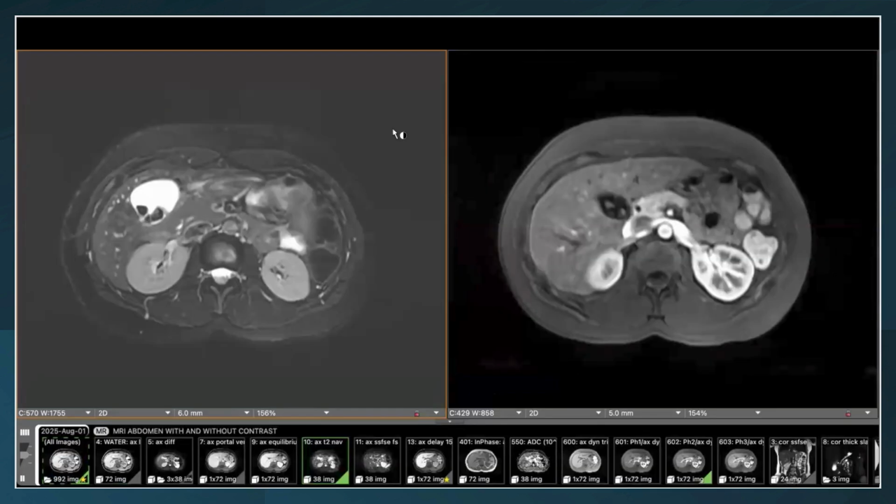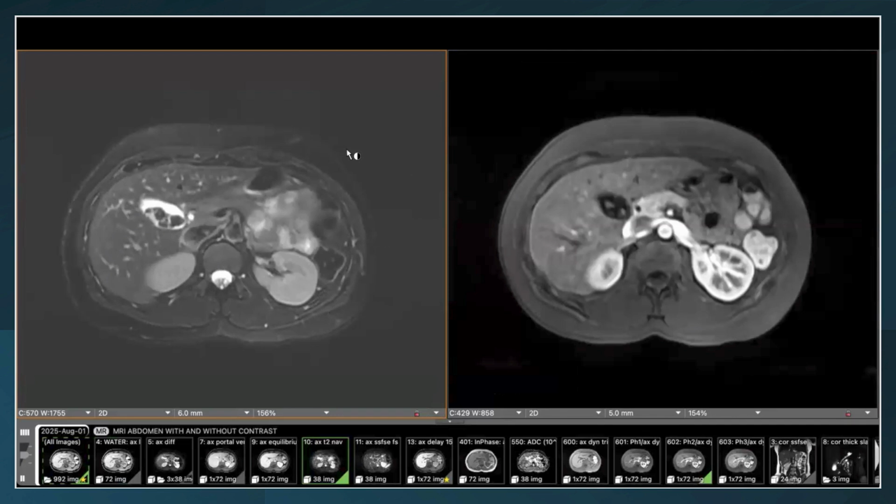So this is the MRI of the liver that was performed with EOVIST to further evaluate and characterize this lesion that we found on the liver ultrasound. So as we work our way through a comprehensive liver MRI, I'm going to share with you some of the ways that I take a look at a case and try to assess what the underlying etiology of a lesion might be. So first, we'd like to start with a T2 weighted image.